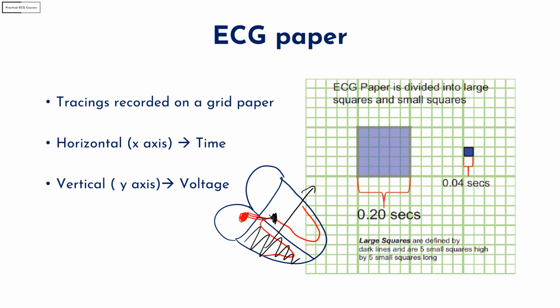Now, when most people are asked the criteria for either LBBB or RBBB, they often start with the morphological criteria like RSR or the rabbit ear in RBBB. This is not correct because you can have RSR or the rabbit ear morphology even in patients without RBBB, but you cannot have RBBB without a wide QRS. This is one of the advantages of concept-based approach. Once you understand the concepts, you will not need to learn things by heart. You can simply derive them when needed. I'm digressing. Let's go back to the original point.